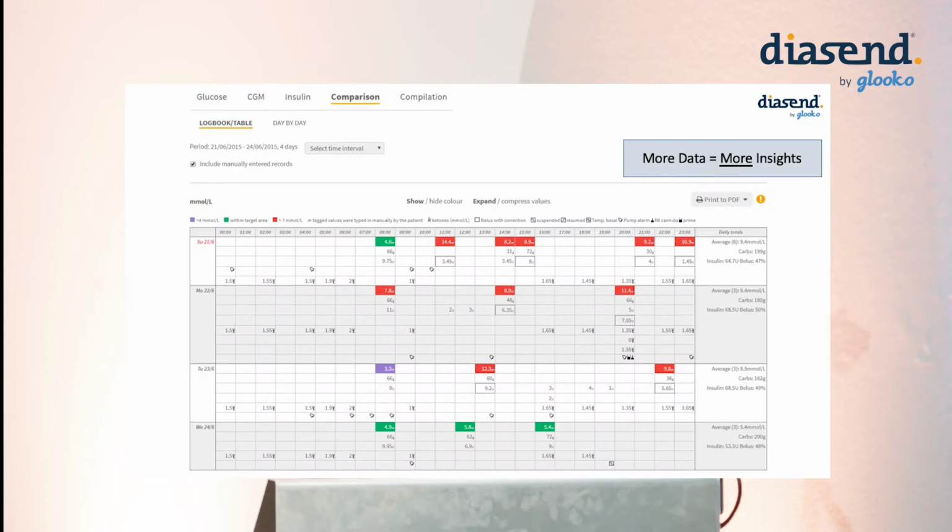And this is somebody who's using an insulin pump, so again, you can see a number of data points. Again, this is going further, so it's got glucose information. Now, it's also got what the insulin pump user has inputted: how many carbs he was eating, the figure in grams, as well as the number of units of insulin he gave. So you're really getting drilled down information specifically on stuff that the individual is doing in their own situation. And you can look at patterns and trends and responses to insulin doses, for example, to certain amounts of carbohydrate, and work out if that was the right dose or not for that particular point in time.